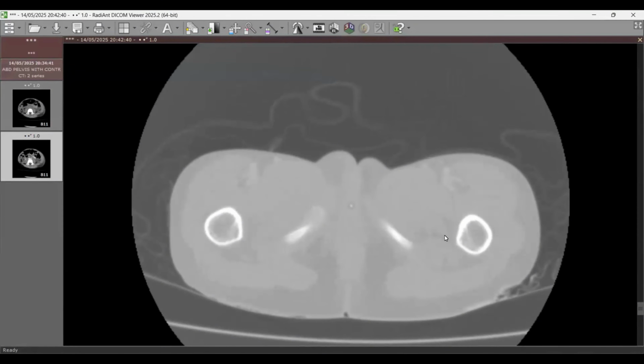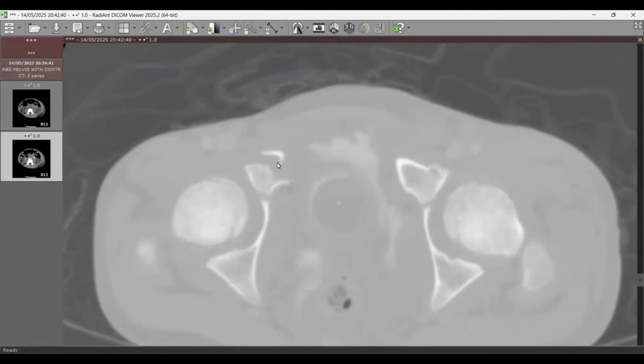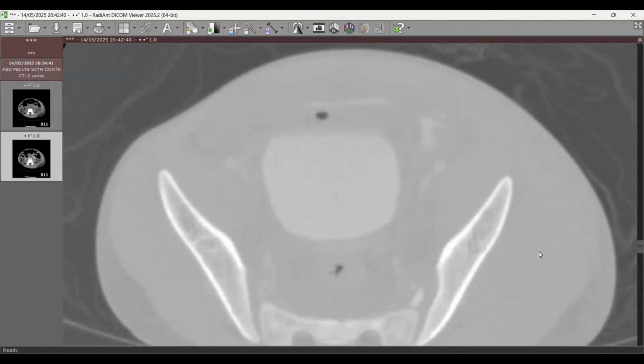Okay. Can you stop using your mouse? Okay. So I will convey the finding immediately. We have the fractures of the pubic rami bilaterally too. There you go. Okay. So, what would you do next?